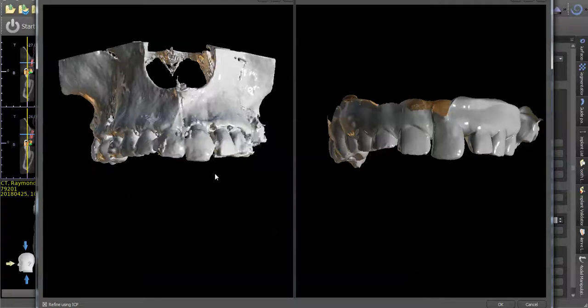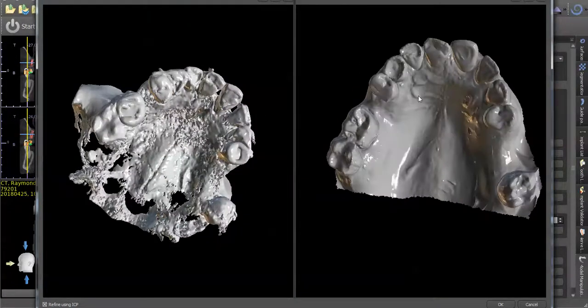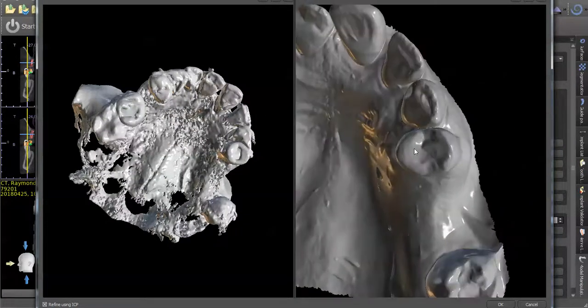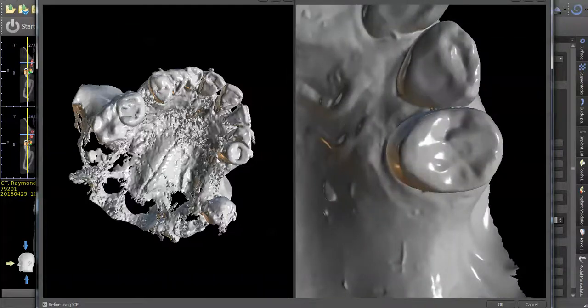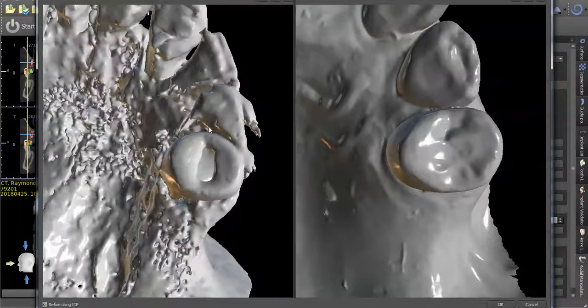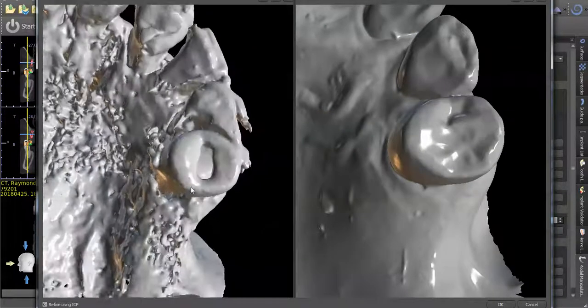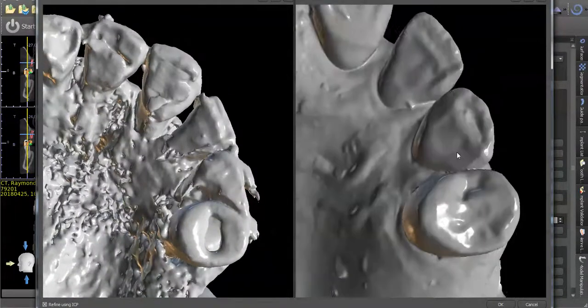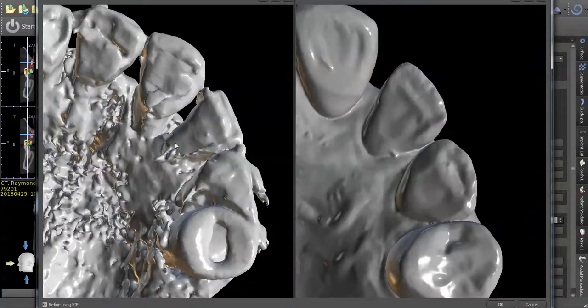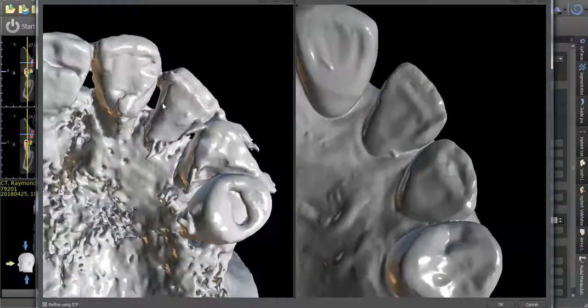All right, I'll pull this model up. So this is much more accurate for points of interest. What you need to do is find some pretty specific points on both the CT data and your model. See, there's a lot of scatter.